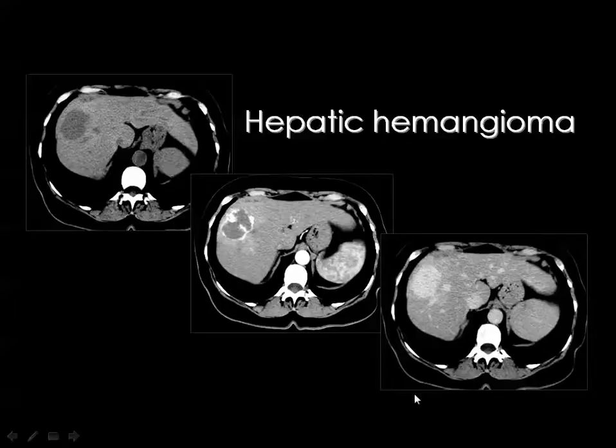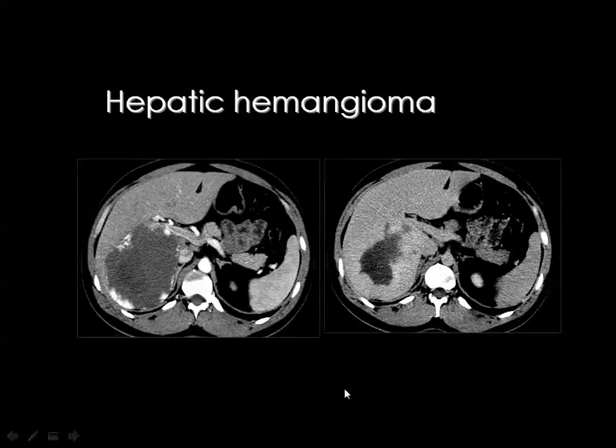One of the major characters of the hemangioma is that whenever you wait for some time, let us say 2 or 3 minutes, then you get diffusion of contrast filling the whole hemangioma, which is known as the iris sign. The iris of the eye, like the concentric centripetal diffusion of contrast media inside the hemangioma.